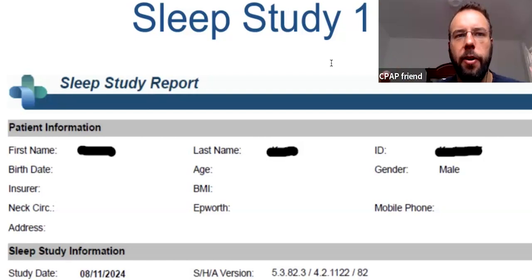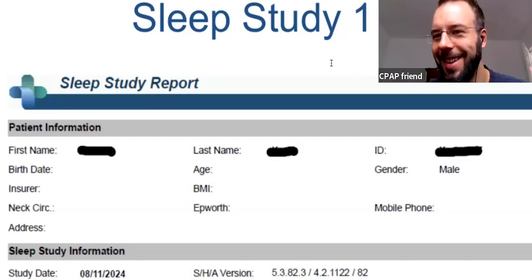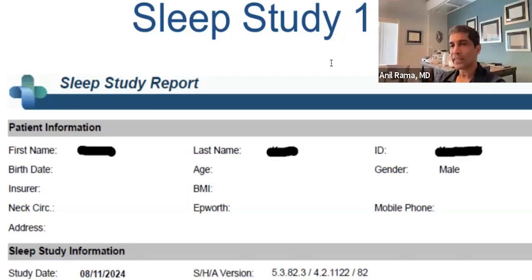Okay, but if I'm understanding correctly, on the healthcare providers' or the physician's end, you do have the option to basically override the results if you want to, right? You do have the option to override the results. And technically, the American Academy of Sleep Medicine says that you should be hand scoring and reviewing all the raw data for each WatchPAT. But no one does it. I can just tell you no one does it. And if they are, they're lying to you. There's no one doing it.